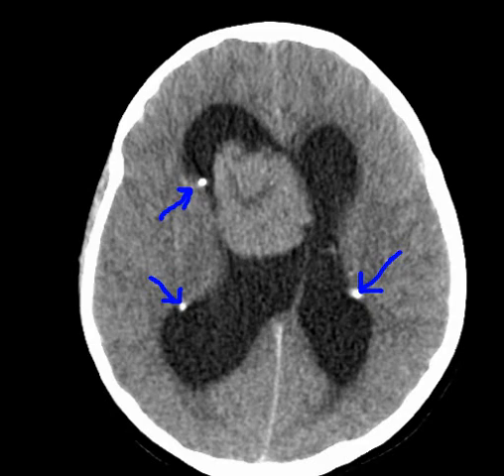So it is an important case. These masses were very large. These are causing obstructive hydrocephalus, with midline shift towards the left side. These are easy to diagnose, but in some exams you will be shown subtle pinpoint enhancing masses which are hard to detect, especially on films, and you can miss them.